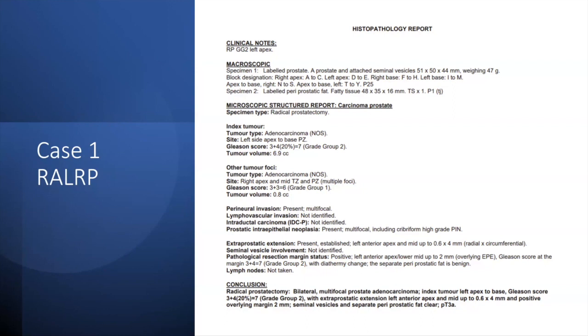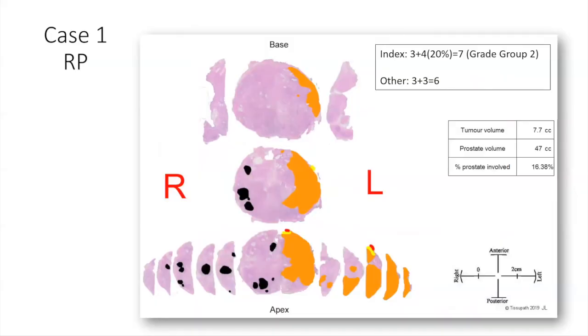If they want to have a bilateral tight nerve spare. But I agree, this sort of extracapsular disease we might predict is there, but I'm surprised, looking at that MR, that you couldn't see that little focal bulge.